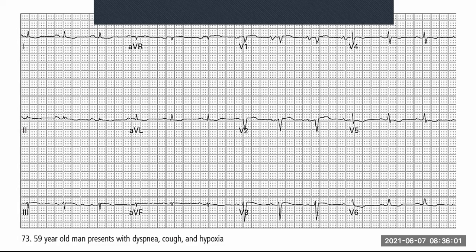That's not 100% okay. We know we've got a left-sided axis. So a left-sided axis tells us what? Either the left side has become bigger or there's damage to the right-hand side. So that's why electricity is going to the left. Right? So we know something's happening on that right. Okay. All right. What's the next part of it?